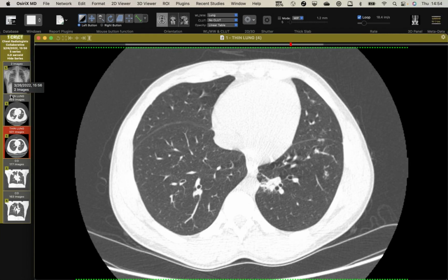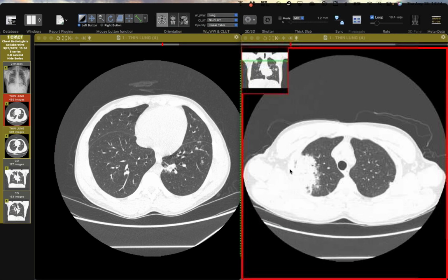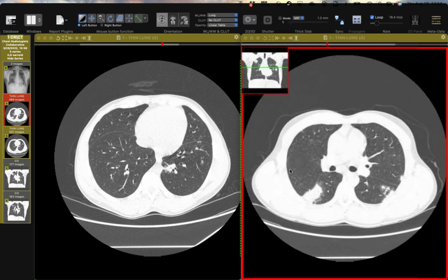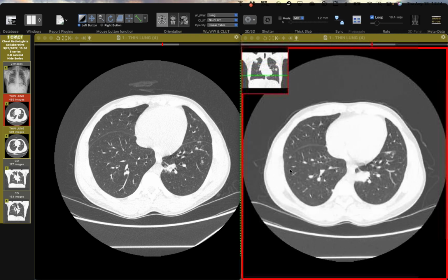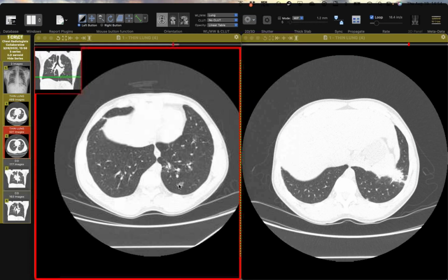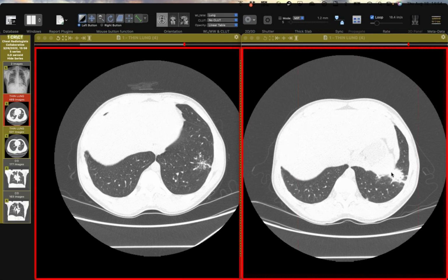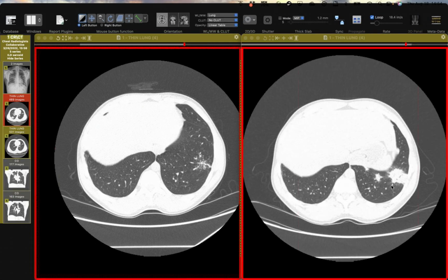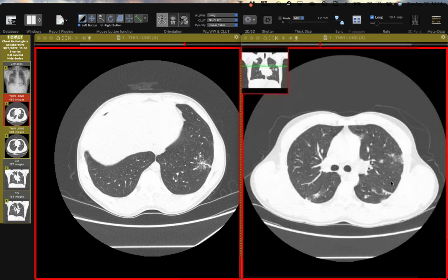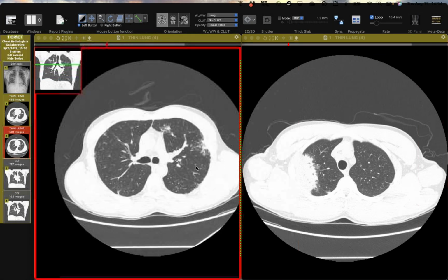Can you show the original one? I don't think I would have ever even put sarcoid in my... Yeah, it would not have been high on my list. Let me put them up side by side. Yeah, I mean, this looks like lymphoma. Yeah, I was going to go lymphoma. And then the OP, eosinophilic pneumonia, lymphoma kind of differential. Right. Well, that's why they brought them. Yeah, it's kind of cool because I've seen a ton of sarcoid, but I only have a handful of cases that look like these discrete consolidative masses. Especially the right upper lobe, massive consolidation. I mean, look at that one. Yeah, I just would have never. No, you're absolutely right.